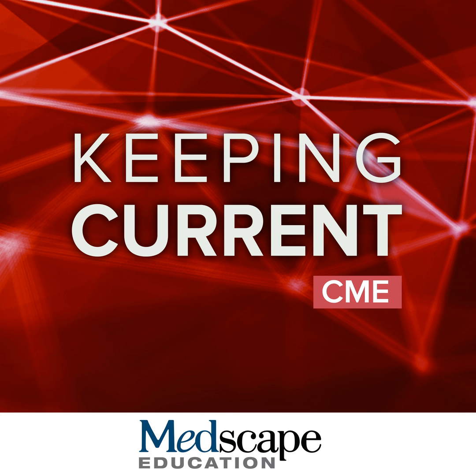Now, how does mapping fit into our cardiac MR protocol? Well, we've seen mapping used in a multitude of other conditions, such as amyloidosis in particular, but it also shows elevated T1s and elevated ECVs in conditions with chronic infarction as well. So it may be useful in that setting. And there have been a number of studies performed.